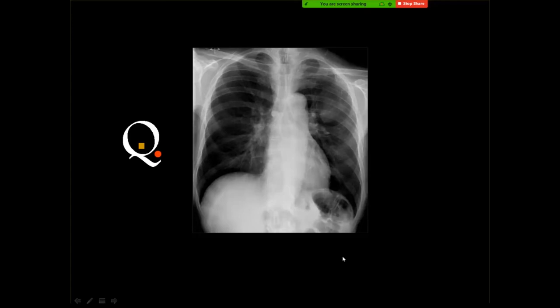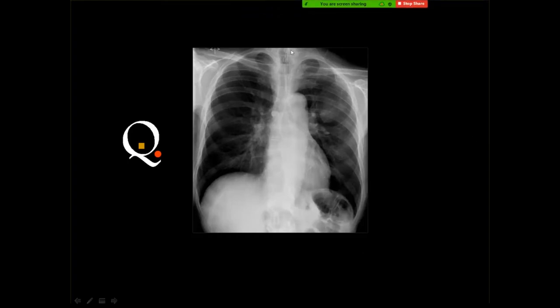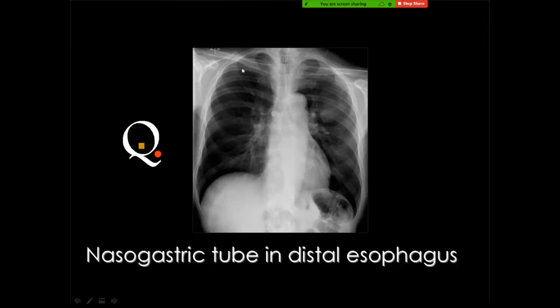Atresia of the esophagus? What atresia was that? Is that a nasogastric tube? Yes, it is. Is it atresia of the esophagus? No, this is an adult patient, and you see air in the esophagus. It is displaced. Yes, this is a malposition. Right. The nasogastric tube has coiled inside the esophagus and back into the upper esophagus.